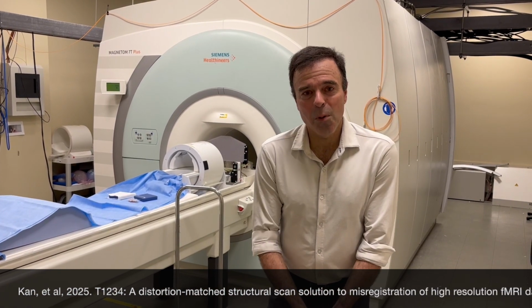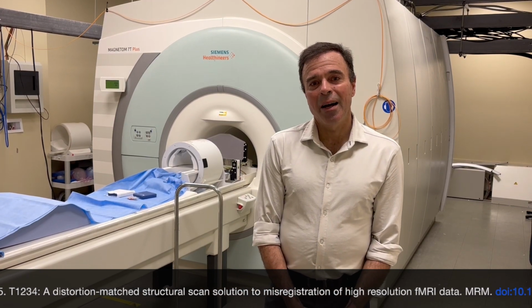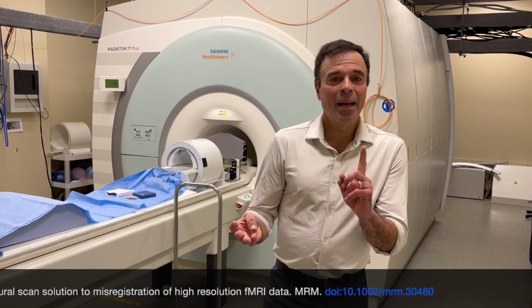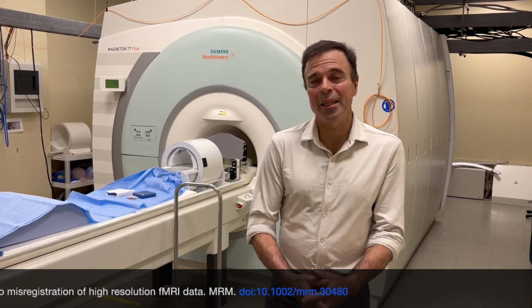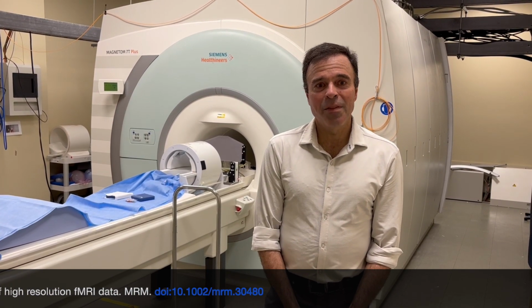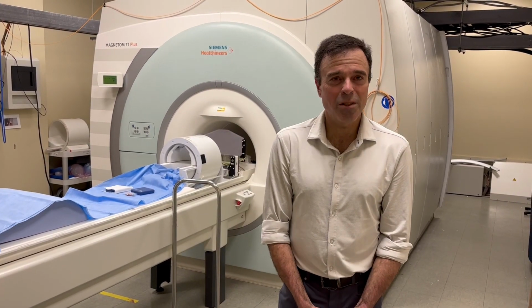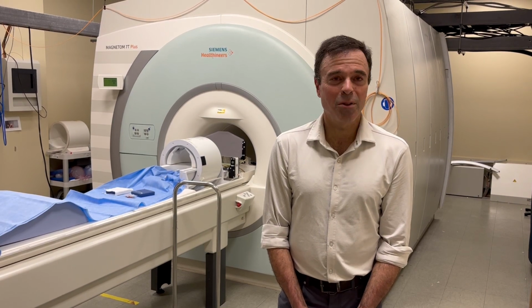So T1234 is a sequence that uses T1 weighting, 2 inversion pulses, 3D EPI, and 4 combinations of spatial encoding. And it's very effective. It's for matching distortions, and it's specifically tuned for very fast MP2RAGE-like structural scans for layer fMRI studies. So it's a very useful technique for everyone to use if they want to directly register the data onto high-resolution structural scans.